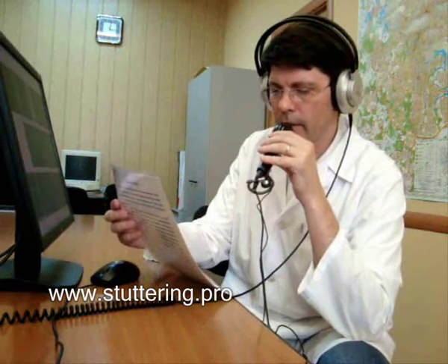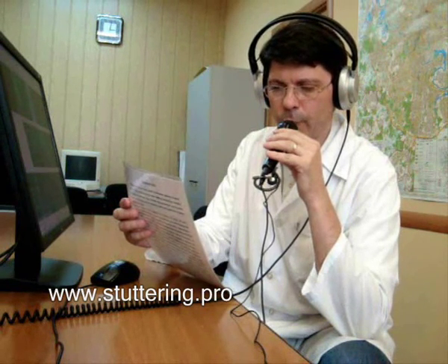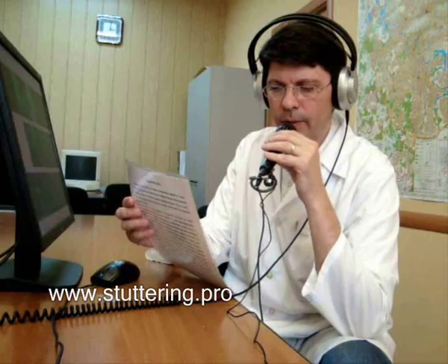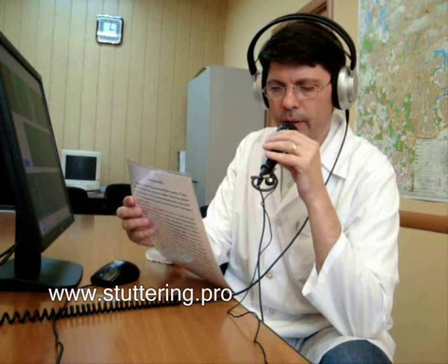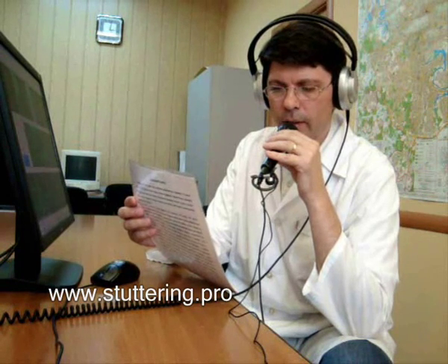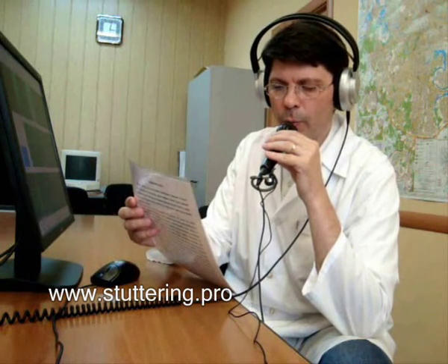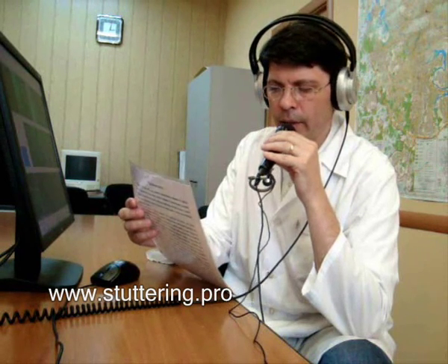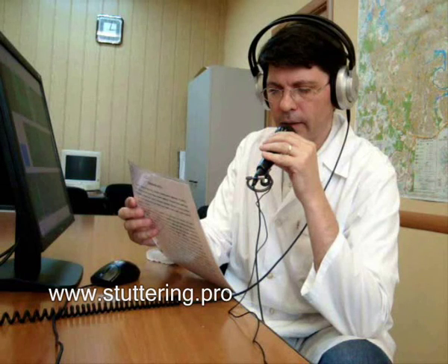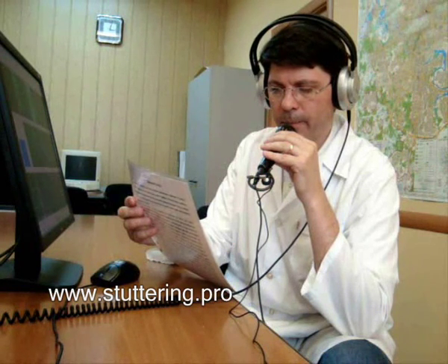So, what does this program do? First, it delays your perception of your own speech in order to break the increased activity and spastic readiness of Broca's area. It's called delayed auditory feedback.